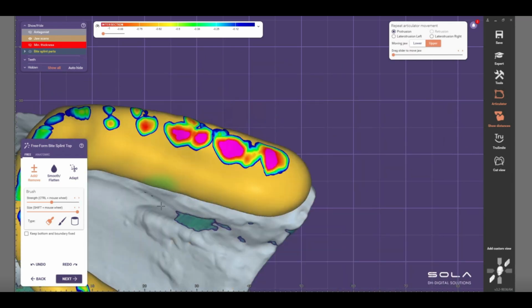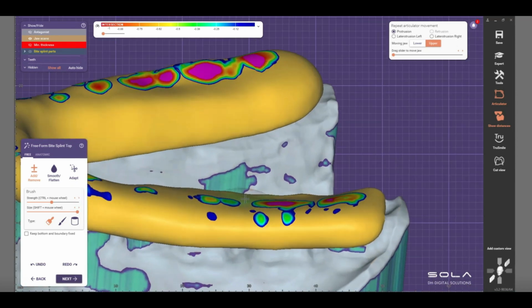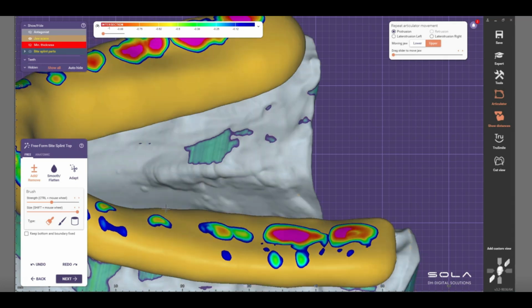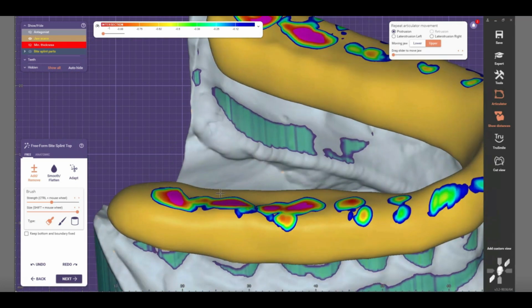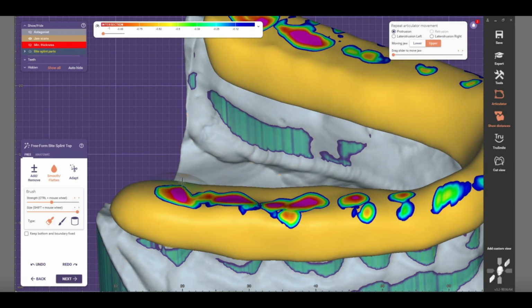That side is done. And make sure these are straight as well from here. So added. And there's no kink. This side. And since I was just adding, I'll add on the other side. And now I'm going to smooth them out. So I go and smooth 50%, and I'll smooth everything out.